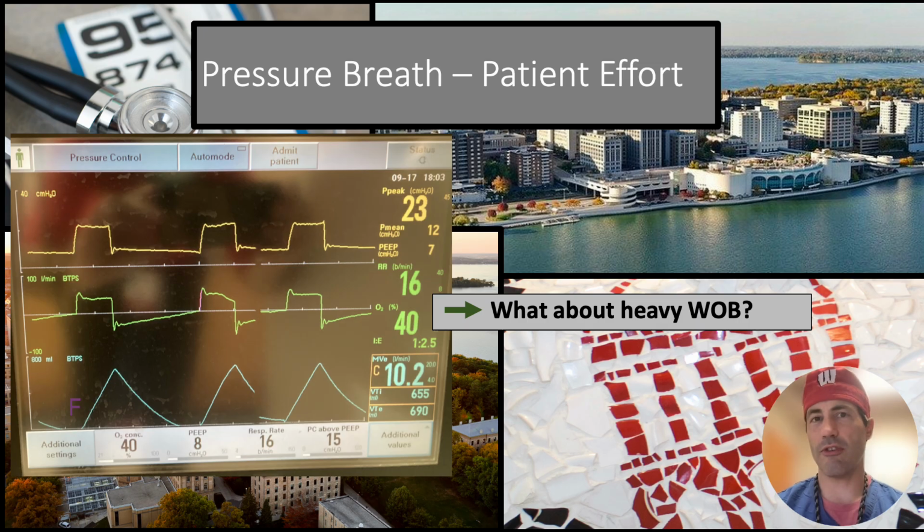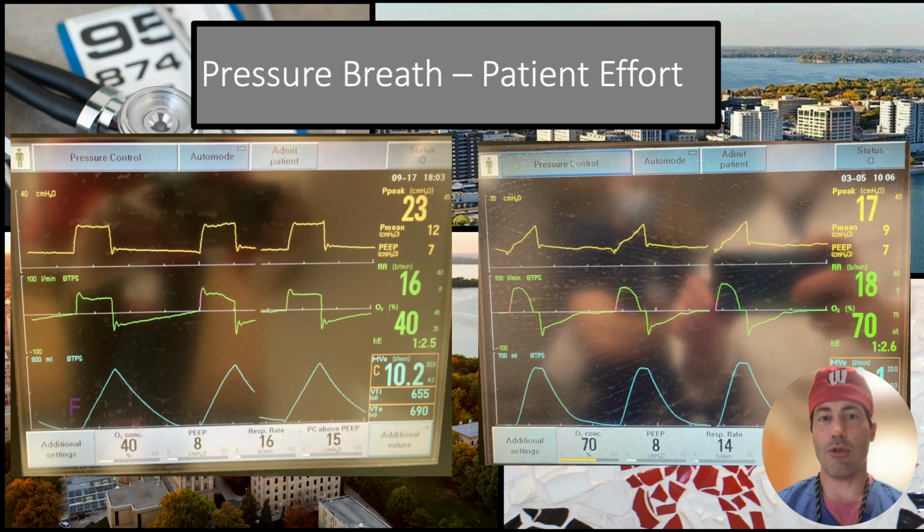Now, if a patient works even harder to breathe, they're very air hungry and strong enough to do it, the vent can't keep up. And so while the vent tries to fix either the pressure or the flow, in a pressure type of breath, we deliver a pressure, it can't even get enough airflow to get to that goal. You can see here we dive off a cliff and the pressure sluggishly goes up, just like our patient at the start. This is where the vent cannot give enough flow to even get there. The patient's pulling so hard, they're beating the vent to the air being delivered. This takes a lot of work.